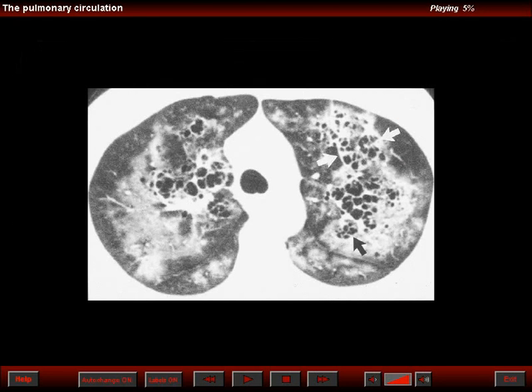This is a patient with PCP. The difference with alveolar proteinosis is that in Pneumocystis carinii pneumonia, we observe bilaterality of involvement, perihilar in distribution, but cystic changes are very prevalent. If there were only infiltrates, the distinction with alveolar proteinosis would be radiographically impossible. Again, we do not see any vascular engorgement, and these patients are free of cardiac disease.